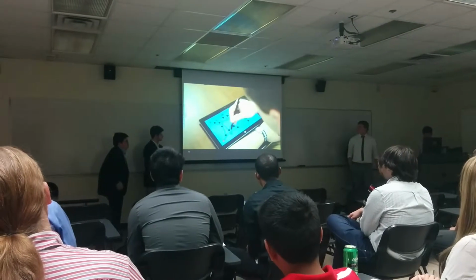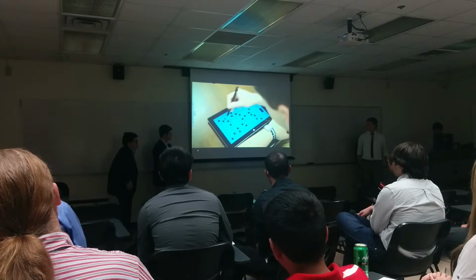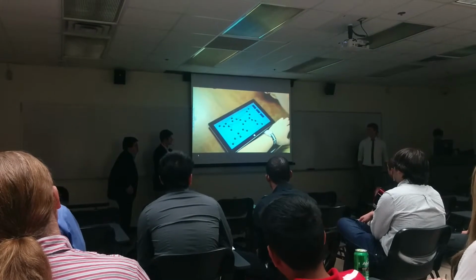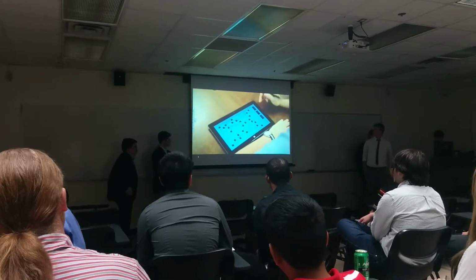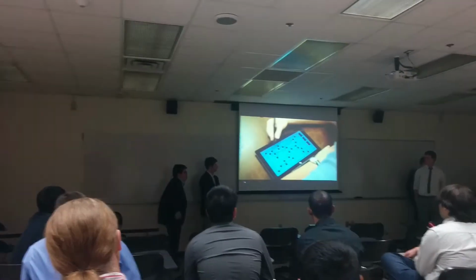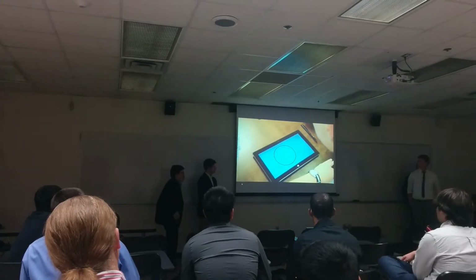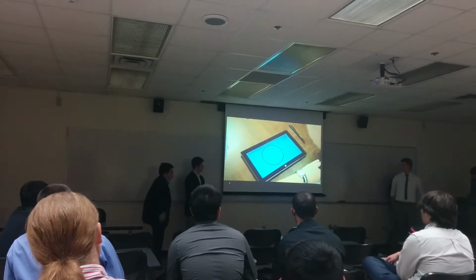test. If the user makes an error, our application shows the user where the mistake was made, as well as suggesting the point they need to return to in order to complete the test. Now that the patient has completed a test, we can compare their performance to what is expected for their age group, education level, and gender. The application provides graphs for this data, which allows doctors to easily assess the results.